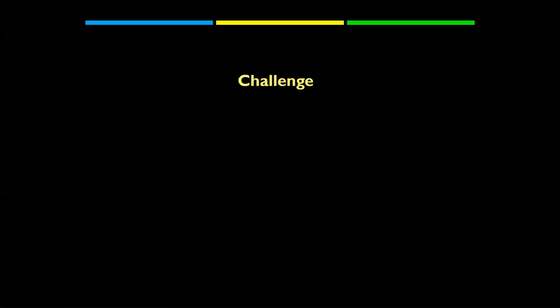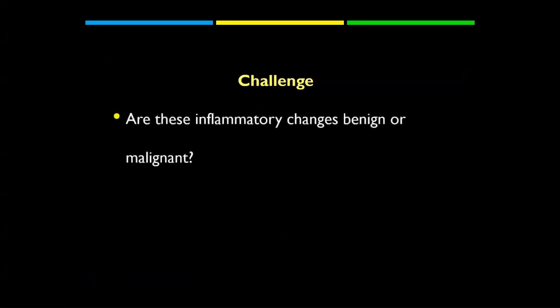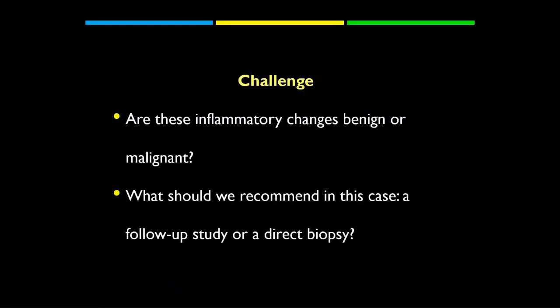And the challenge in this case, are these inflammatory changes benign or malignant? And what should we recommend in this case, a follow-up study or a direct biopsy?